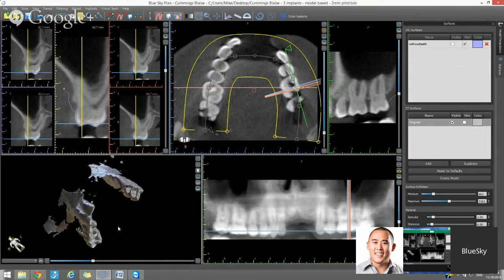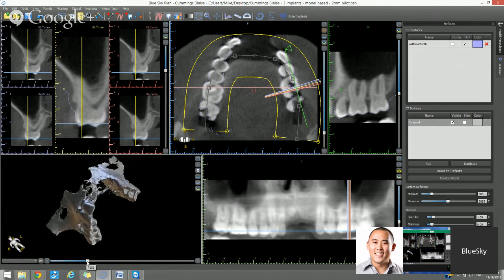If it's an edentulous case, then there's a different protocol. The patient should probably be wearing a scan guide at the time of the CT. If it's not an edentulous case and the patient has some teeth, then there's no need for that unless it's a very high scatter case with a lot of metal. But most cases are fine with just the model.